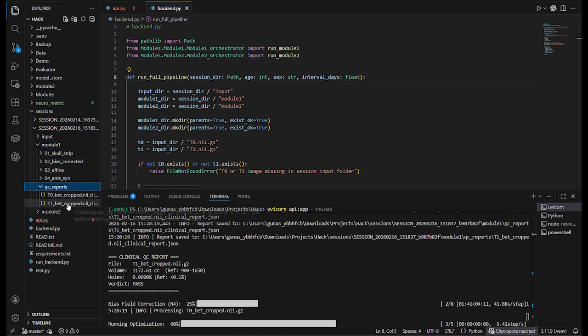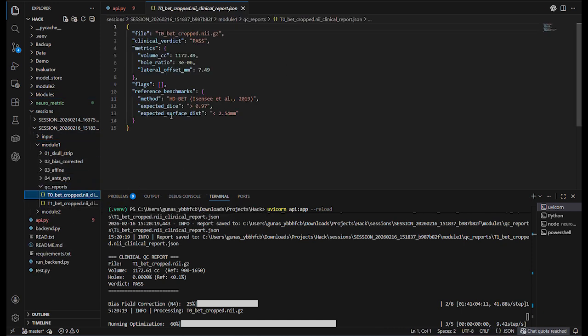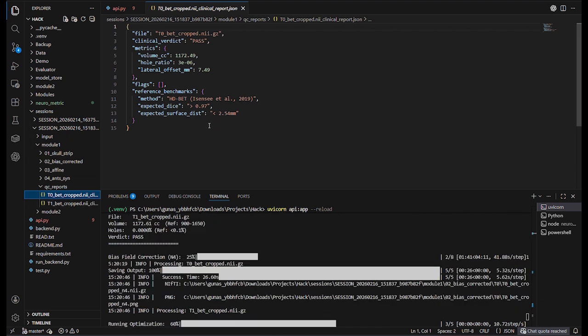And the path will be stored over here. As we can see, the QC report is completed, so we can expect the dice score and these things can be changed by the researchers or scientists as they require. Once it has been done, it will slowly progress. Here I just used the normal values from Google, as I researched that and grabbed those values.